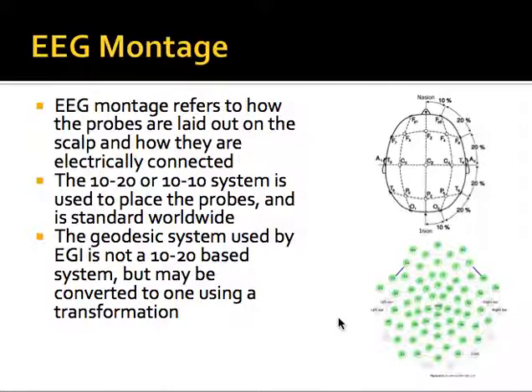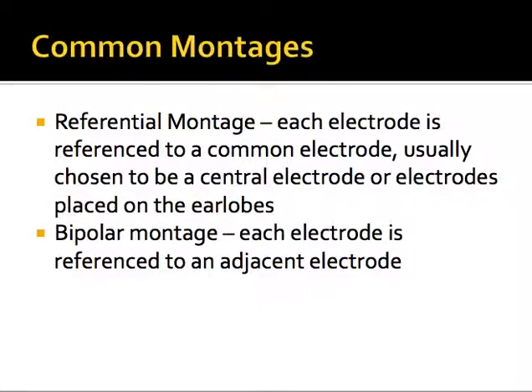First of all, it minimizes any localized areas of force that might cause pain or discomfort. And secondly, it tends to have an equalizing effect on the impedance between the probe and the scalp, since these tend to be high impedance systems and work off of a solution as opposed to a gel. So those are the two common kinds of caps.